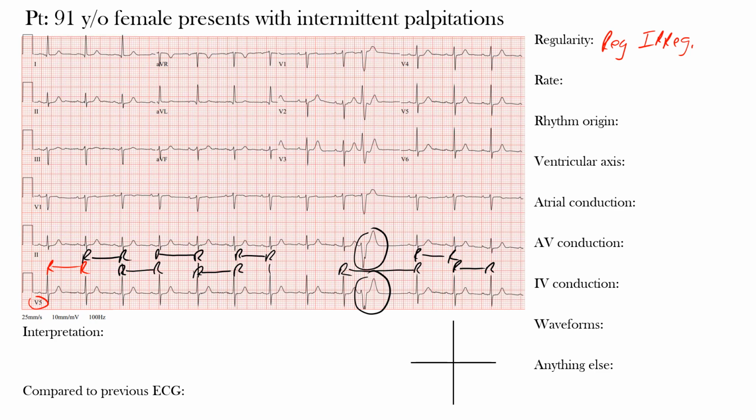Hopefully that makes sense. So what did you get for the heart rate? Well, there's a couple ways we can calculate it normally if we have a completely regular rhythm.